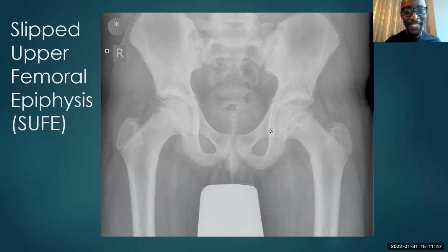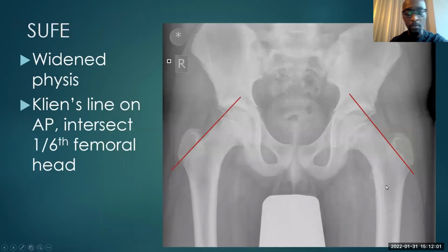Love it. Very, very good. Oh, both. Oh, do you know what? I like the both because that is a point that we need to discuss. In this particular one, it is on the left-hand side, and I'm going to hopefully convince you why that is the case. We're going to learn about some lines.